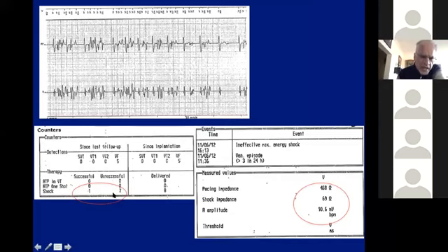When we look at the counters, you see that the device thought that it had 7 unsuccessful shocks. So the device was delivering shock after shock because it was seeing more and more noise. And then I looked at the pacing parameters. Amazingly, pacing impedance is pretty normal. High voltage impedance is also pretty normal. R wave is okay. So that brings another subject.